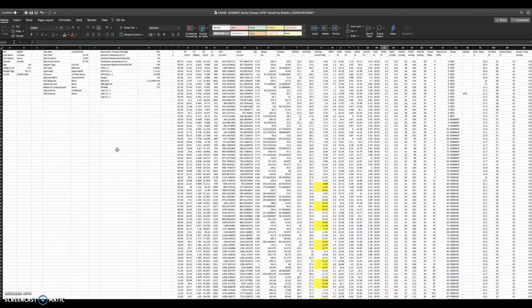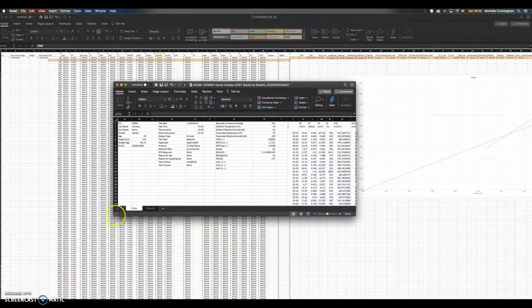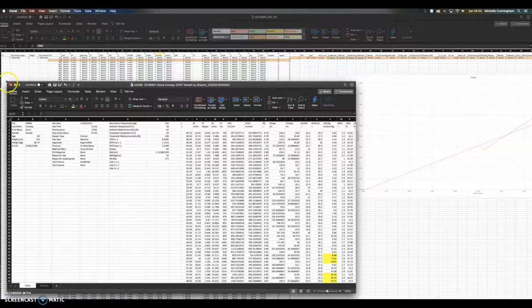Sorry, has this been recorded on the screen? Hang on, let's pause. Okay, I just want you to look at this screen here. It just wasn't recording there for a second.